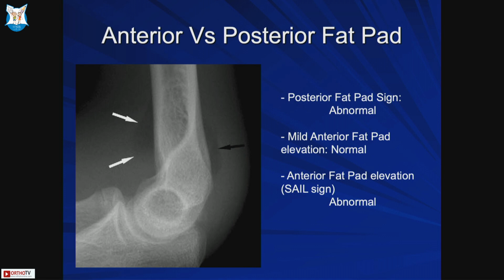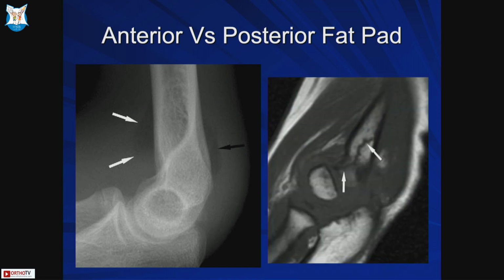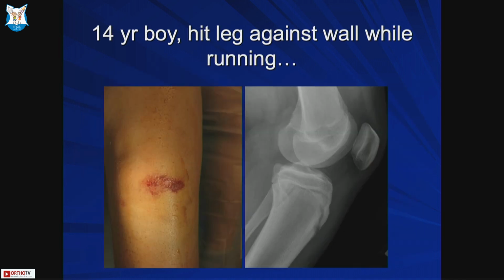This patient came with an MRI, had a fracture. A lot of times these fractures are very small. You don't need MRI or CT scan. You just look at the shadow. You know that something is wrong. As long as you can rule out an intra-articular fracture like a trash lesion, you can just treat them conservatively without knowing what fracture it is. And proximal radius fracture is very common, as well as supracondylar fractures.